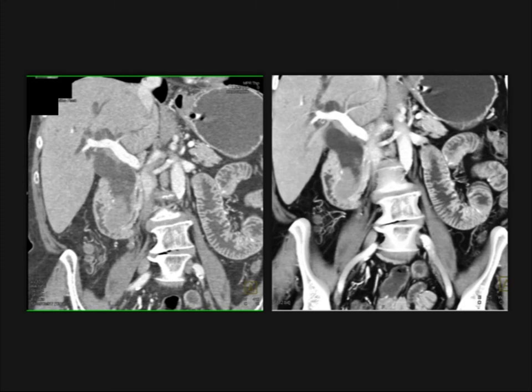This patient previously did have a duodenal cancer years ago, but the soft tissue mass could be a non-opaque stone or sludge causing obstruction. It could be that on the images just beyond this, there's a stricture, be it inflammatory or neoplastic, so it could be a common duct adenocarcinoma causing obstruction. It's not a choledochal cyst because you would see a cystic outpouching with a choledochal cyst, even if you developed a carcinoma in a choledochal cyst.